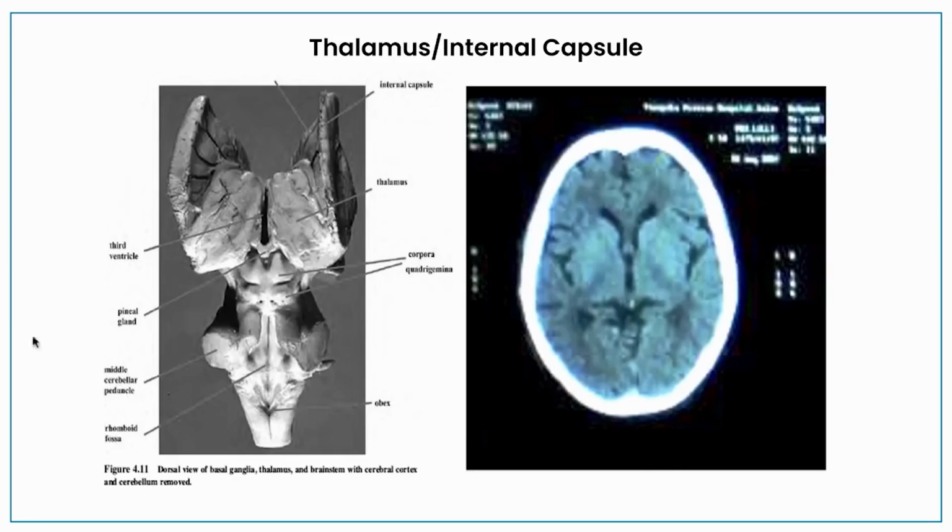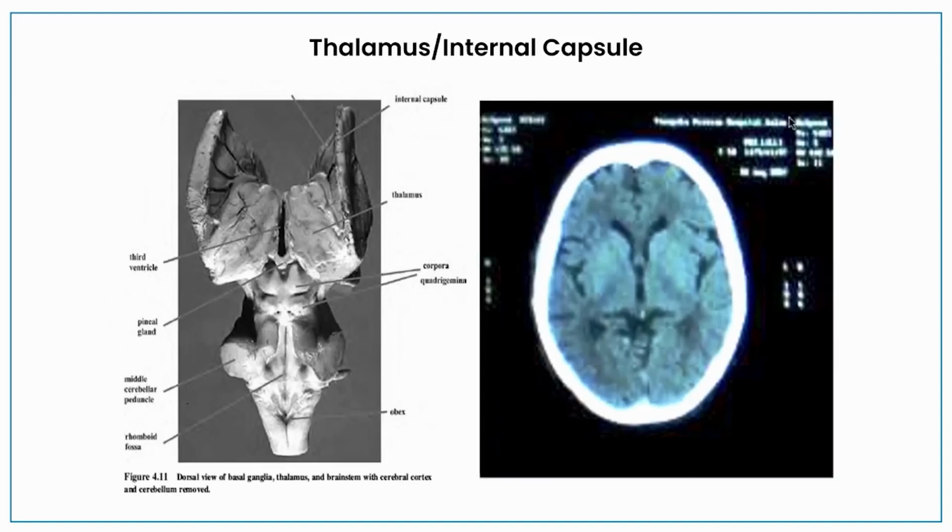Look at it clearly. Above the brain stem, you have quadrigeminal cistern, you have third ventricle. Lateral to the third ventricle, you have thalamus on both sides, and right next to the thalamus there is a bat wing shaped structure, right. Now pay close attention to the image which I am showing on the screen. Look at it and try to make a correlation between these two images. It's very obvious. You have a central slit-like structure.